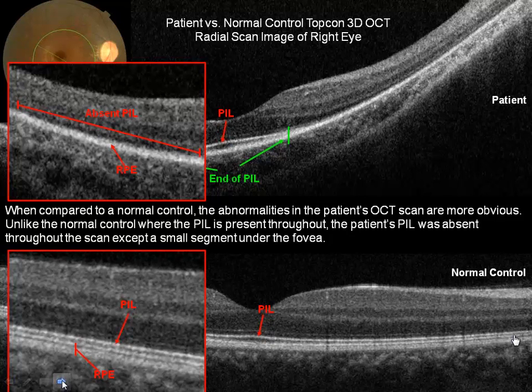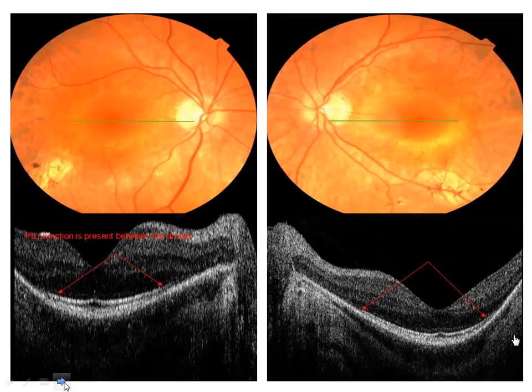So you could make a diagnosis of retinitis pigmentosa just by understanding how to interpret the OCT. You could confirm it with an electroretinogram, as we mentioned before, and the ERG will be flat under the scotopic or rod conditions, but will probably still be present somewhat under the photopic conditions because there are cones present centrally.